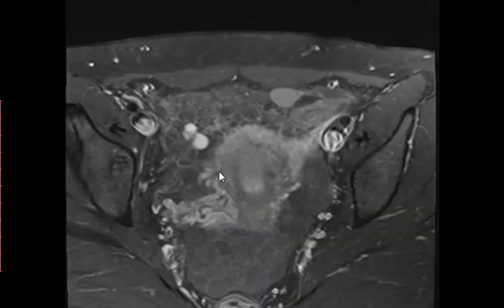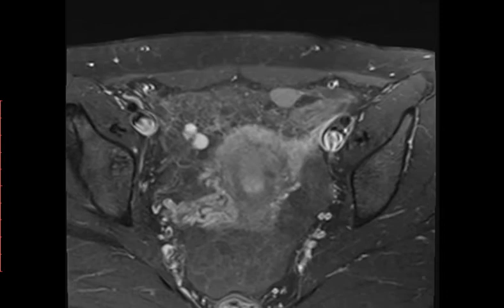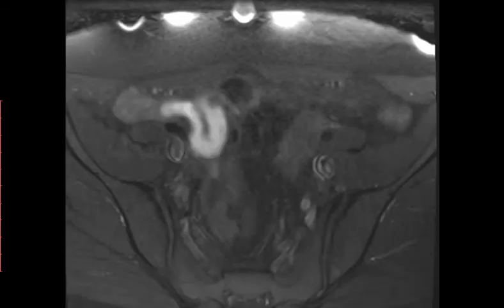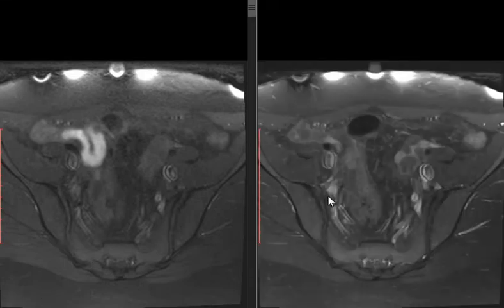So this is post contrast, of course. This is T1 post contrast. T2 post contrast. Just wait, Ariane, leave the mouse. Just a second. T2, T1. Put a mark at T1. T1 fat sat. Okay. Why they didn't do T1 is weird. Anyway, this is T1 fat sat. Let's do both, the pre-contrast and this is T1 fat sat post-contrast. Let's see.